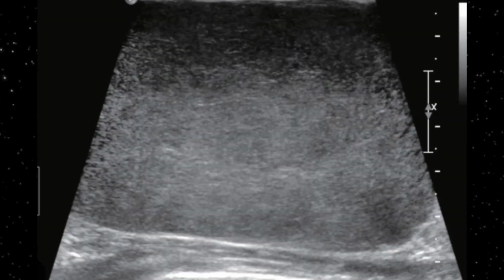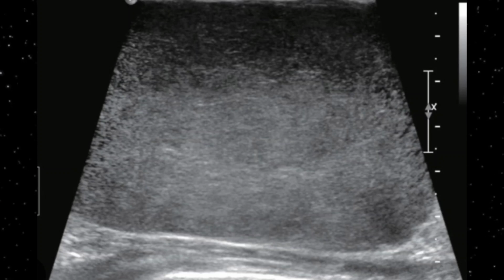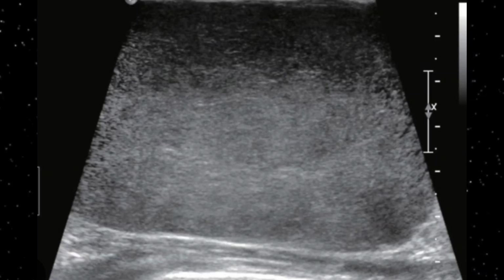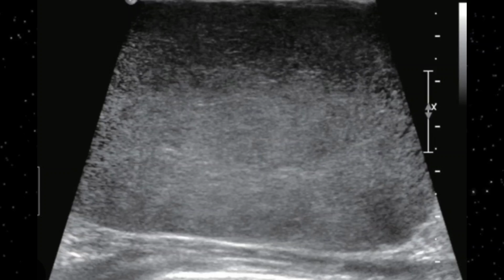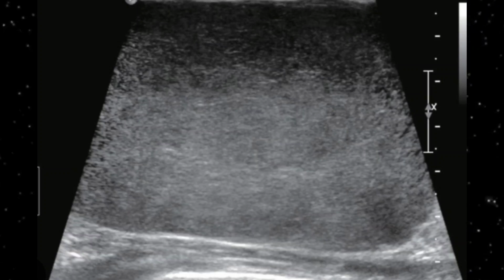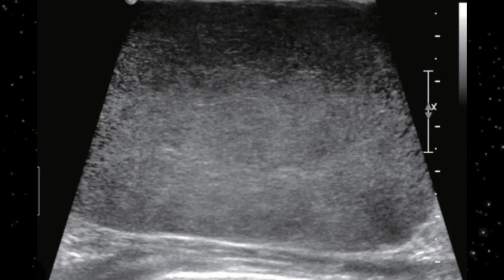Look at this lesion. It is a magnified view, just to make you understand that this is, to some extent, called homogeneous. Although it is not fairly homogeneous, comparatively I could find this slide on the internet, so I just presented it to you for the explanation of uniform echogenicity. So I would consider it a uniform echogenicity. This is most favorable for a benign lesion.